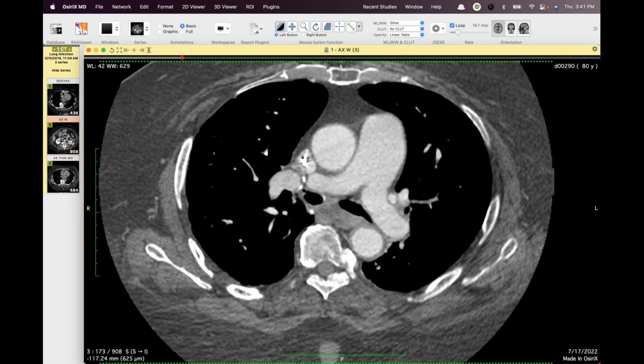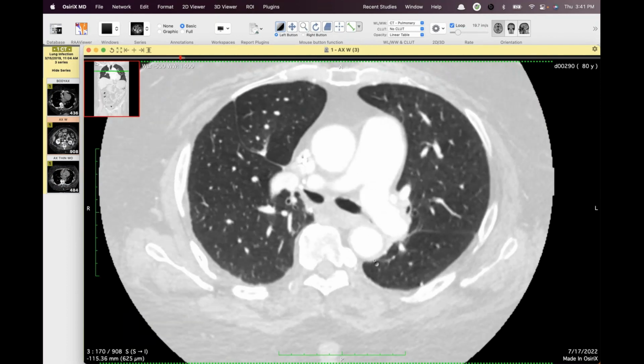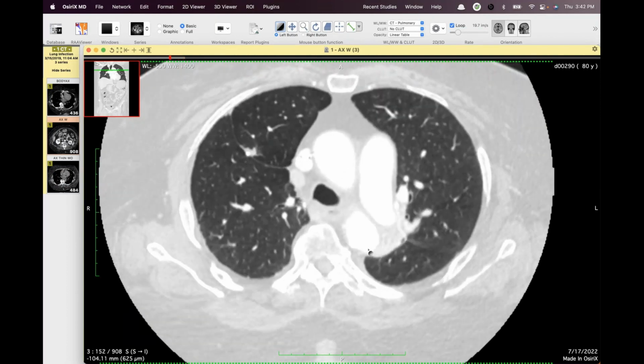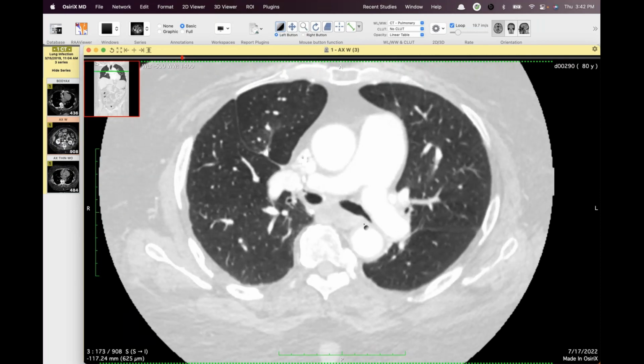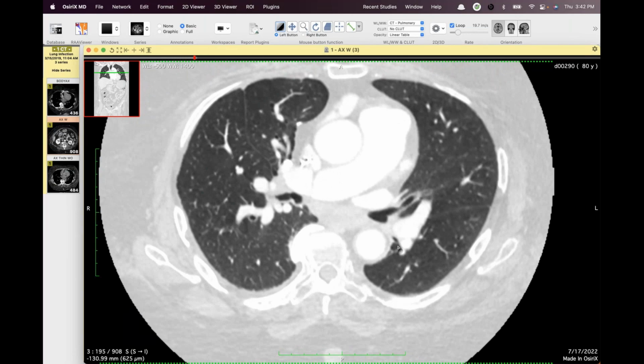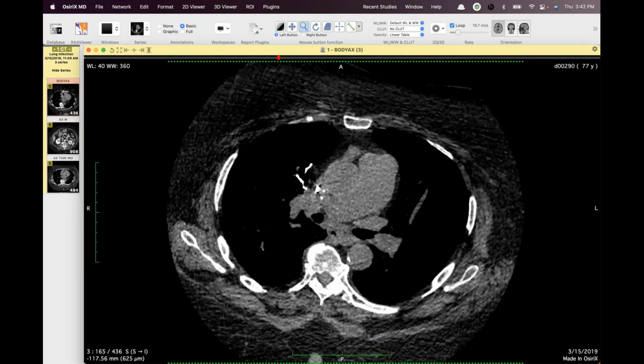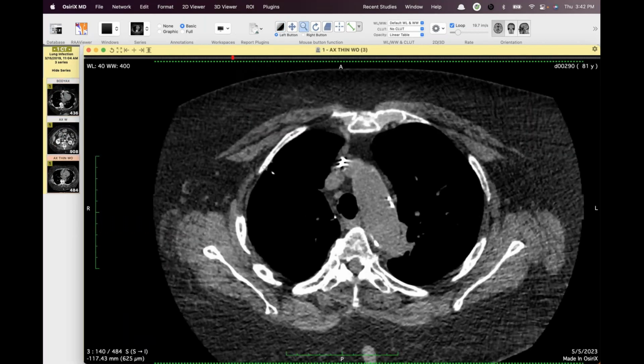But when looking at the airway, I noticed this funky little thing when I was reviewing this with my fellow. You can see it's kind of a curious bronchus right there. I don't know what that is. This is the study that we read. Let me just show you the follow-up, and then I'll go back to what I think cinches the diagnosis.